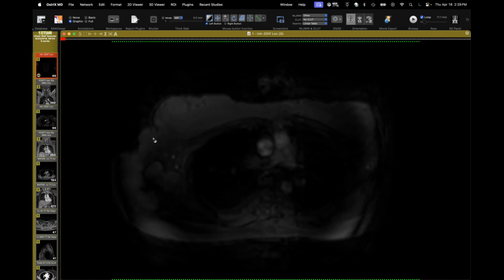Usually because they're ingested and work their way out, unless they're aspirated after getting in the upper aerodigestive tract. But I like your idea. I think it got into systemic venous return, and that's what I suspect. Even though the gut drains to the portal system, I think there's some systemic venous drainage too. Like I said, I've not seen a lot of coexistent liver and lung disease.